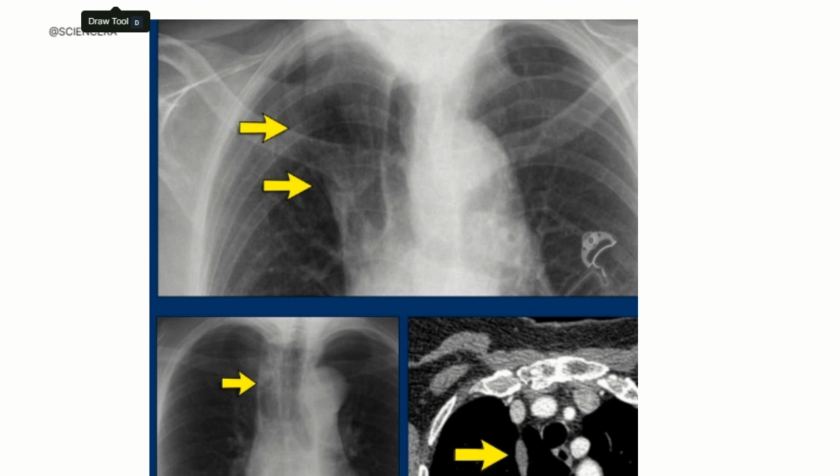So here you can see there's a little bit of a split in the upper part of the lung, and when the doctor looks at the X-ray, they see this split as a thin line that crosses the top of the right lung, and there's nothing to worry about. It's just how some people's bodies are built. But you can still identify your azygous vein in the chest X-ray.